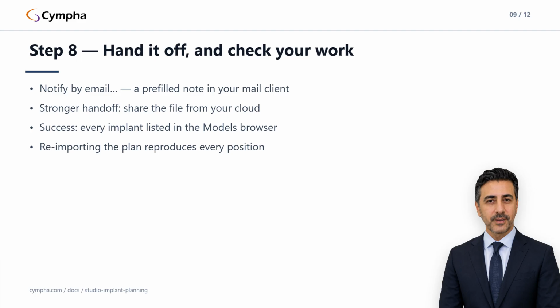Second, and this is the one to remember because it looks alarming when it happens: if implants ever show up without their sleeves, don't rebuild anything. Just re-import the plan. Import plan re-adds both the placements and the sleeves, so a single import restores the complete picture. It's a 30-second fix that people otherwise spend an afternoon on.